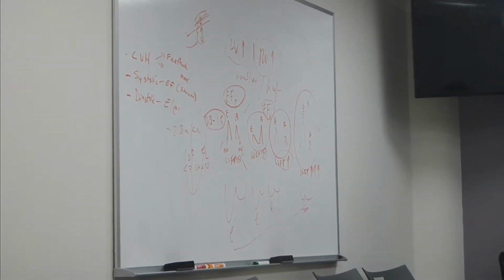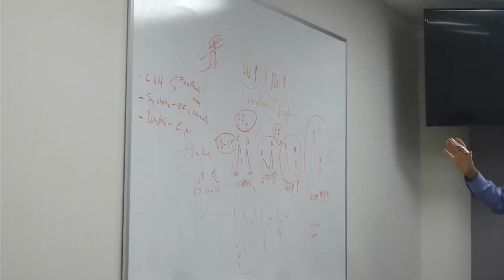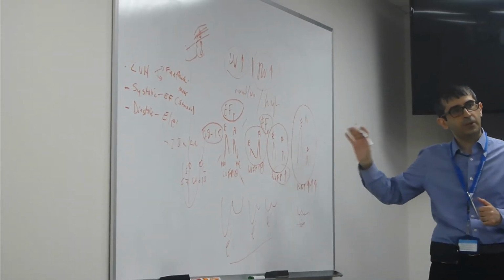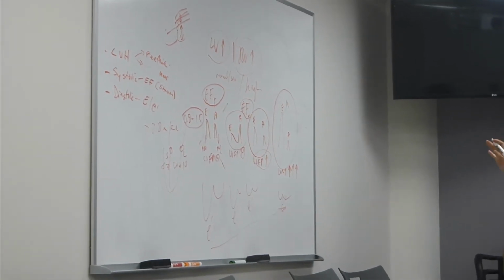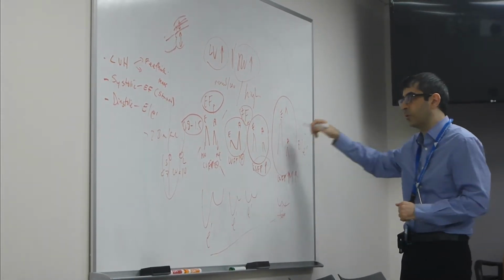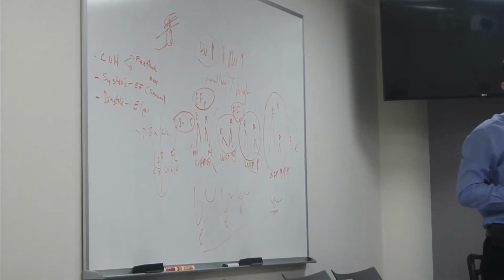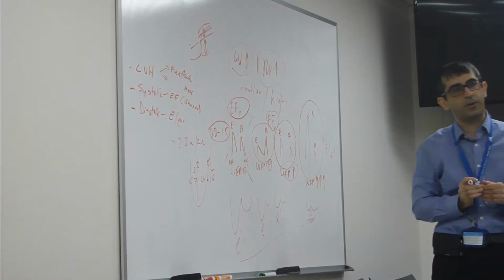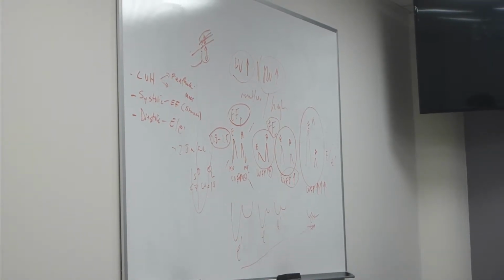So, again, I think that with reduced EF, it's a little bit easier to see where you stand on the filling pressures. With preserved EF, you have to look at multiple data points, not just stick to the E to E prime ratio, which progressively goes up as you go through the filling pressures, but also look at other things like: is there LVH, is the LA large, is there significant TR, is the RA pressure elevated. So you have to put all this together to get to your conclusion.